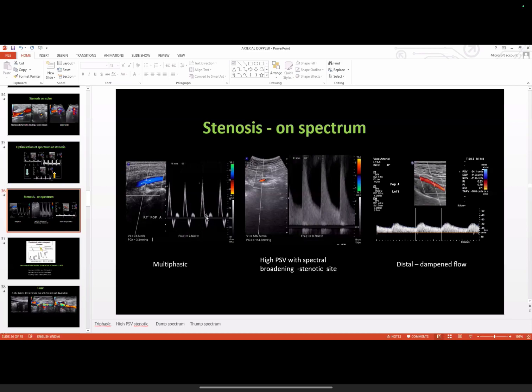So the spectral bandwidth will be increased, because at this time these are the velocities, very few at this time, at peak time. This is time and this is velocity. And at this time, you can see the peak RBC flowing rate, intermediate, low, low, low, and here the RBCs are very low. So it will fill, because on the y-axis this shows the number of RBCs running with variable velocity. So this will fill the window, and this spectral broadening indicates disturbed flow.